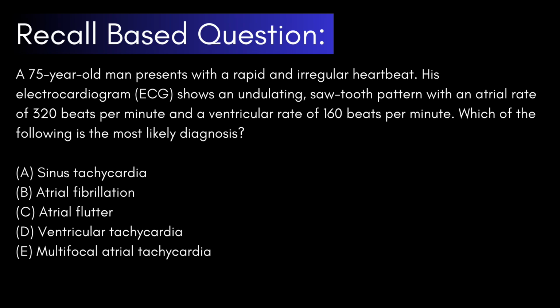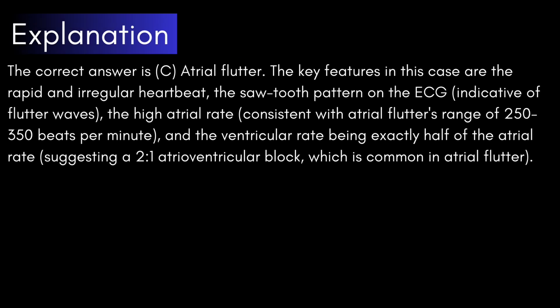All right, I think I gave you guys enough time here. I'm going to move on to see what the correct answer is and what the reasoning behind it is. If you need more time, feel free to pause the video. Otherwise, moving on now. The correct answer is C, atrial flutter.